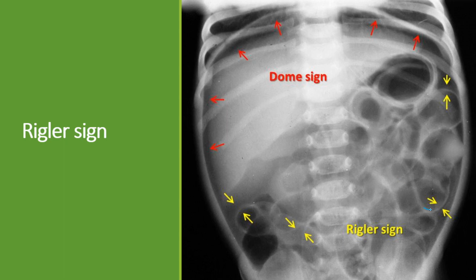Yes, both sides, bowel wall: gas within the bowel lumen, and gas within the peritoneal cavity. And we see the wall of the bowel. You can see it there.